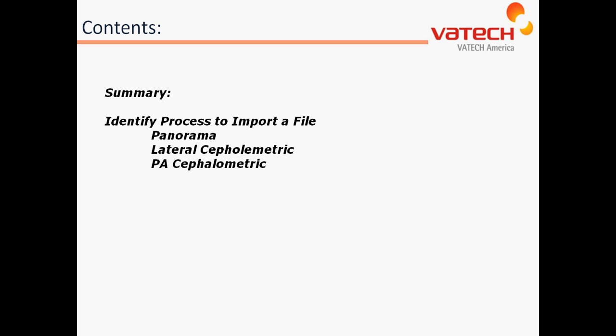This completes our tutorial to import a file into the EZDent-i imaging software to include the panorama, lateral cephalometric, and PA cephalometric image. Thank you.